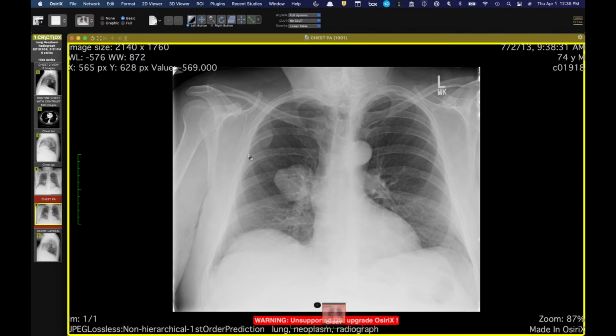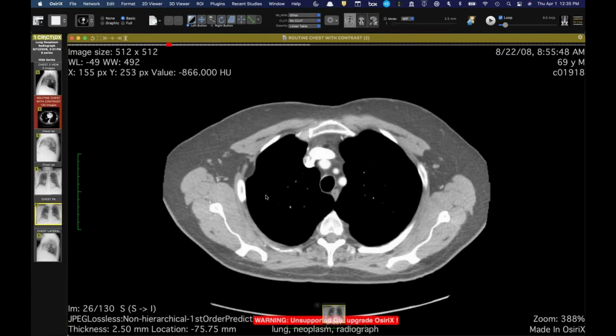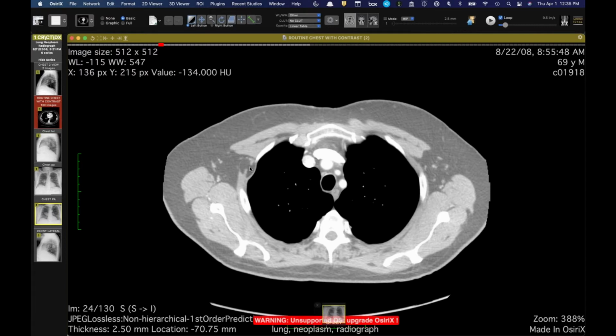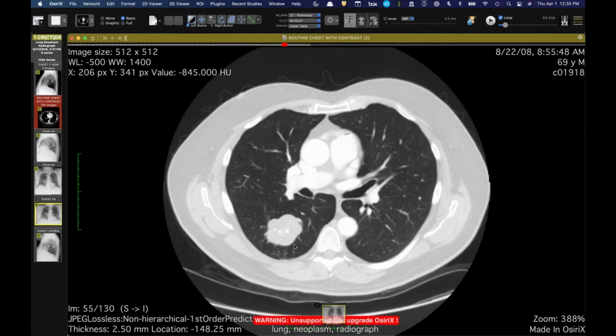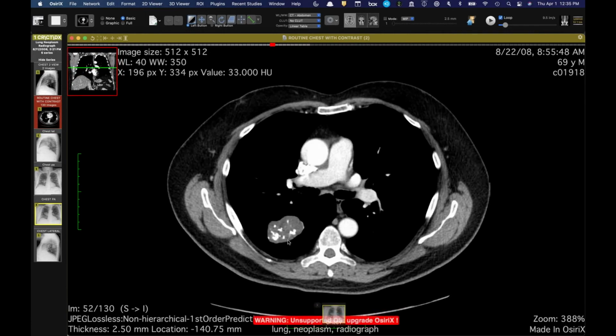So of course this suggests it's either abutting the pleura or arising from the pleura or chest wall, and there's no destruction of the underlying bone. And so this one's just a little lipoma in the chest wall. Sometimes these get called pleural lipomas, or extrapleural, but this one probably just arose outside of the intercostals, because you can see there's some breach of the intercostal there. And then this did turn out to be a hamartoma, but just a nice radiograph with some fun teaching points to it.